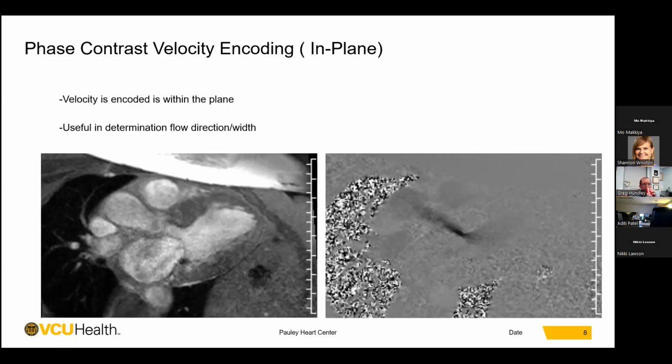You can also pinpoint the area of obstruction like a PW in echo. You can also see the point at which the step up in velocity occurs, and with that, you can determine where exactly the highest velocity is, which is about here in the LVOT in this case.